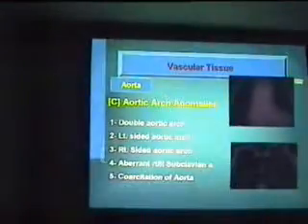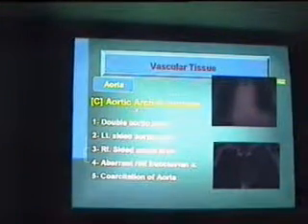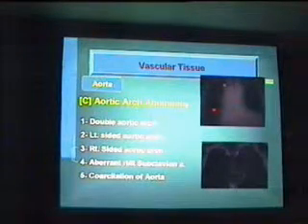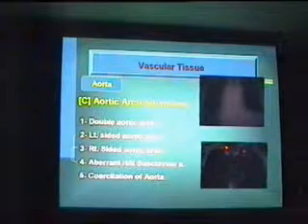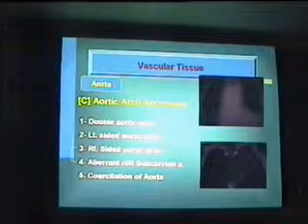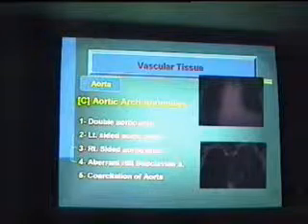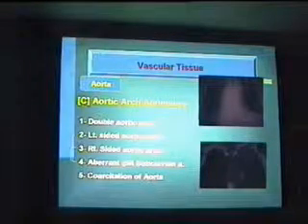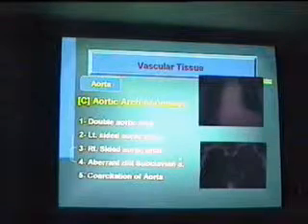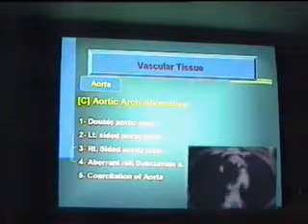طيب خلصنا من الأورتيك أنيوريزم والدايسكشن of the aneurysm، نروح لحاجة ثانية اللي هي aortic arch anomalies. والأنوماليز of the aortic arch are either double aortic arch زي ما أنا شايف هنا عندي اتنين أورتا في السي تي في البلين تشيست والأم آر، أو عندي left sided aortic arch ومعاها بيبقى right aberrant right subclavian. أوكي؟ دايما الليفت يبقى معاها الرايت، أو عندي right sided aortic arch with aberrant left subclavian، أو عندي coarctation of the aorta. Let's see some examples.